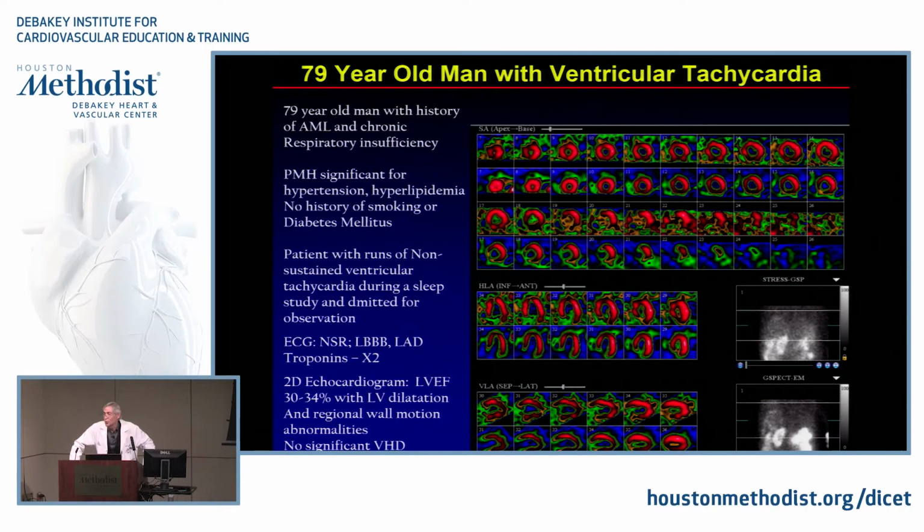Mohammed, since this is a fellow session today, but I don't have a fellow, I'm going to ask my one and only fellow there, what do you think about these images?